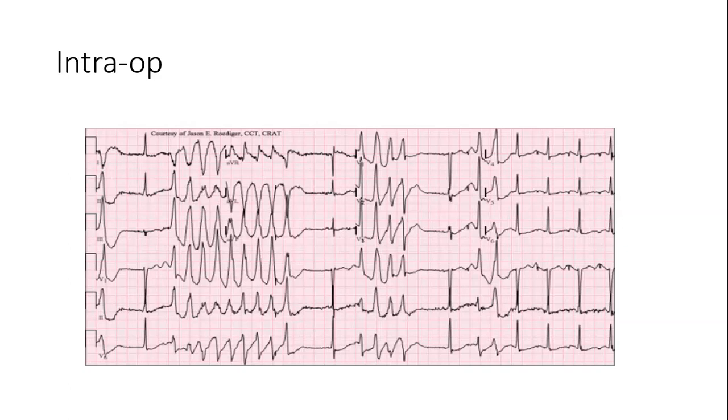You're not wrong to say it's a ventricular tachycardia because of the broad complexes, but unfortunately, it's one of those where you can't miss it's a Torsades. Because if you just stick to ventricular tachycardia, my next question would be, what would be your pharmacological management? You won't think about it if you don't know it's a torsades. If you just generalize, because there are many types of ventricular tachycardia, if you get what I mean. So generally, its name is a polymorphic ventricular tachycardia, but this is a torsades.